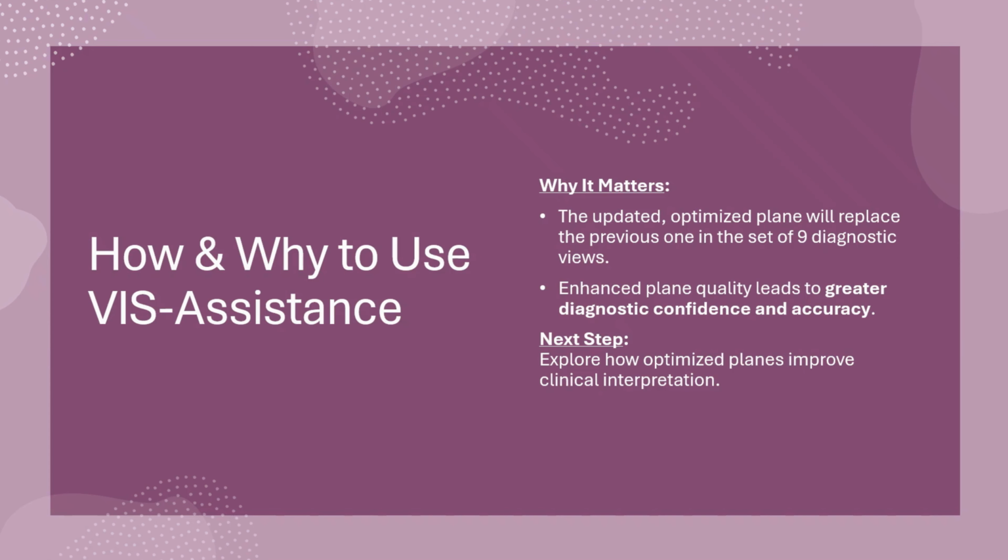Why does this matter? Once you update the diagnostic plane, the optimized view automatically replaces the older one in your 9 plane set. No extra steps, just better data. And here are the key takeaways. Improved image quality means better clarity, which leads to stronger diagnostic confidence and more accurate assessments. It's all about seeing more, guessing less, and making your evaluation count.